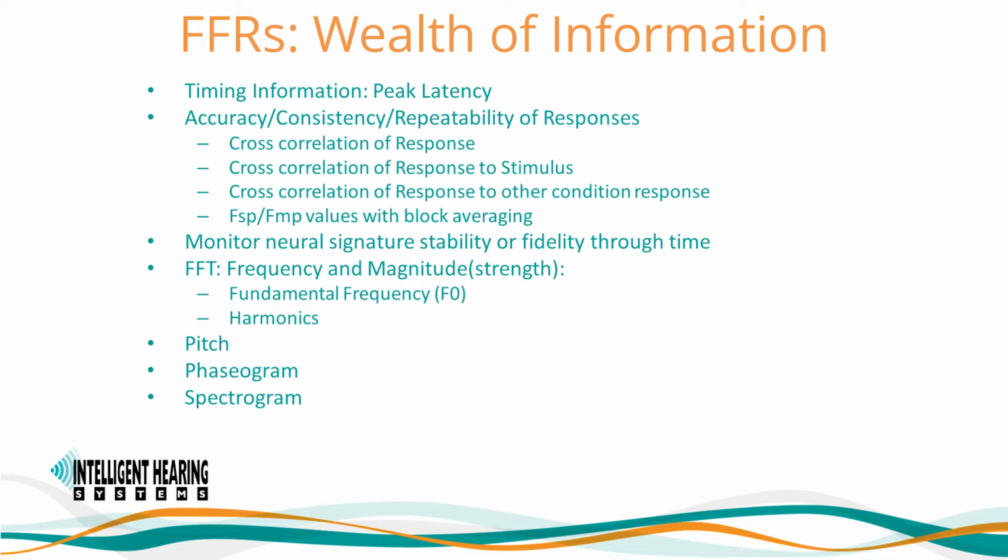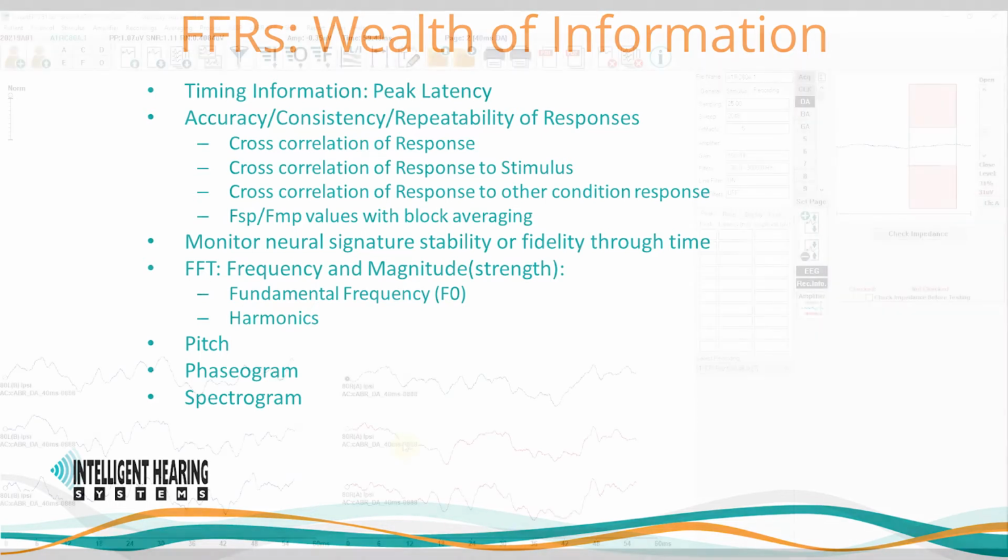Phaseogram information can also be obtained. This provides timing difference insight between the transient portion versus the steady state portion of the response. And finally, spectrograms provide time frequency distribution of response, noise, and signal-to-noise ratio.